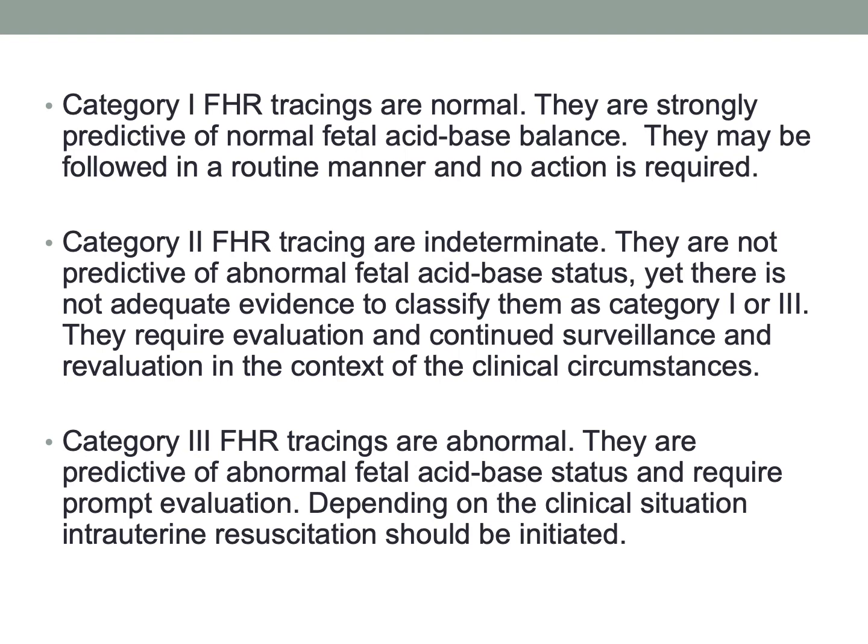Am I going to respond to these category 2s in the same manner? Absolutely not, okay? The one that's a flat line with 0 variability, I'm probably going to be a little bit more aggressive in treating than the one that's perfect with 1 variable, okay?